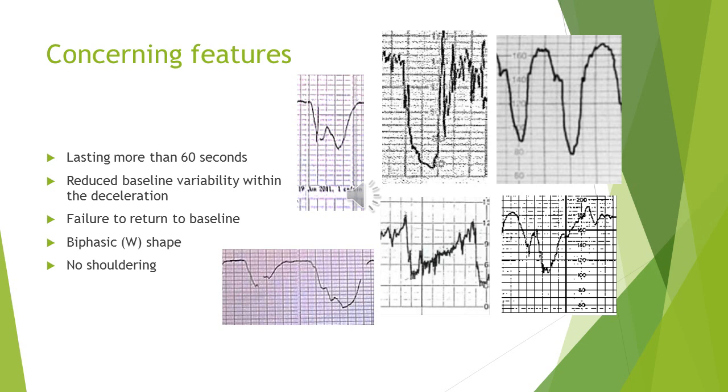Or no shouldering, especially if it was present before. So sometimes deceleration is associated with shouldering either before or after the deceleration, which means a sudden acceleration after the deceleration. If this shouldering disappeared after its presence, it's a concerning feature. However, if there was no shouldering from the start of the CTG, then it is okay.